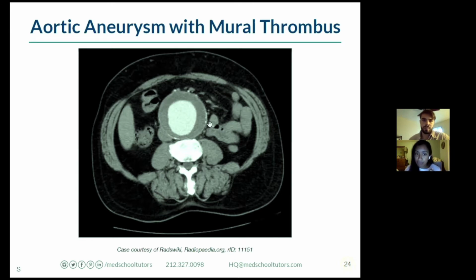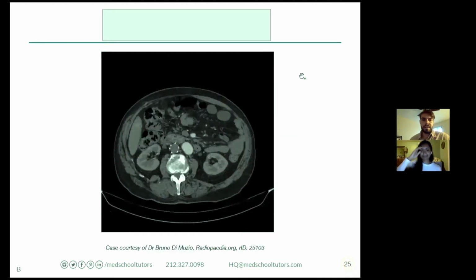And you see this thrombus here as well inside the lumen, to suggest that we have thrombosis. And perfect. A lot of people got that too. So again, use those landmarks to figure out what you're looking at, because sometimes it'll look so abnormal that you'll think, I don't even know what I'm dealing with here. Absolutely. I think that is a rule that I always tell students.